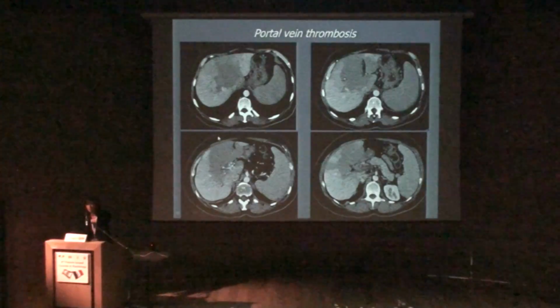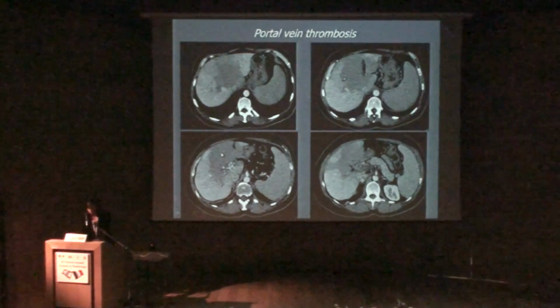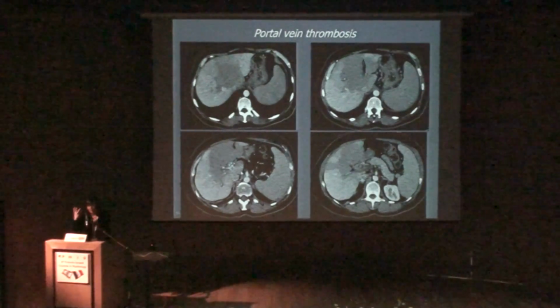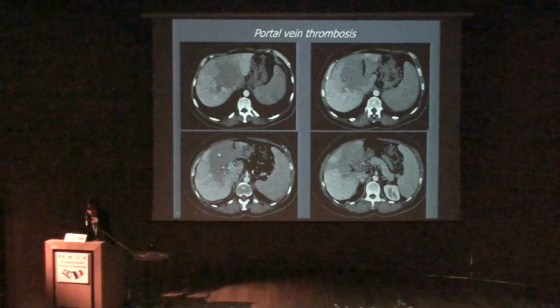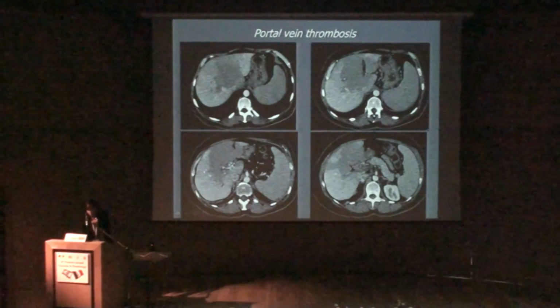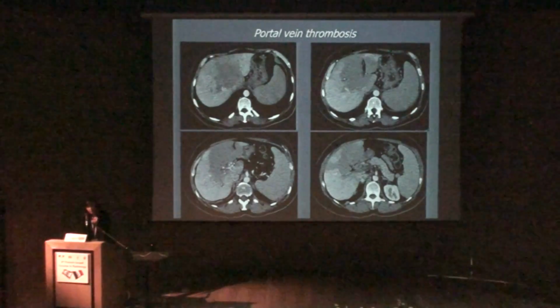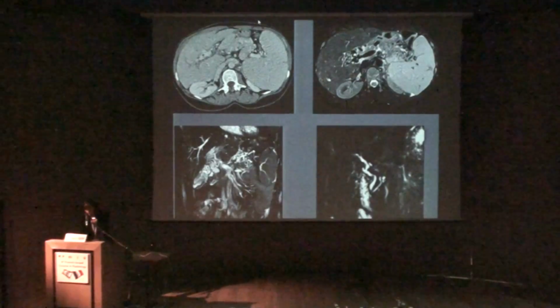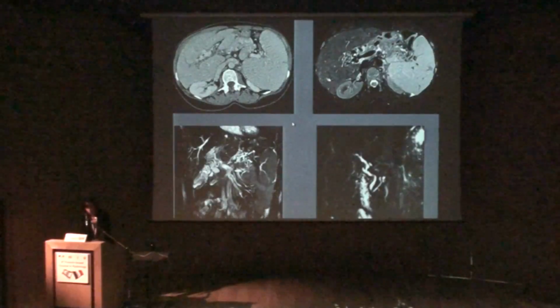And this is what the Japanese radiologists have called the zonal anatomy, differentiating the central liver, which doesn't correspond to any anatomical landmark, from the peripheral one. And again, on arterial phase imaging, the normal enhancement is in the center, and there is an increased enhancement due to the lack of portal perfusion in the peripheral part of the liver. And indeed, in this patient, weeks after, we could see very well the development of portal cavernoma.